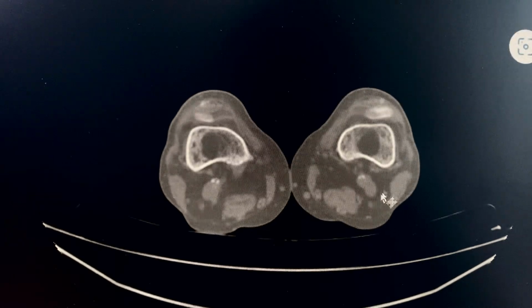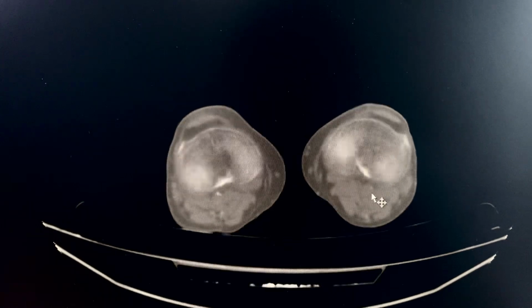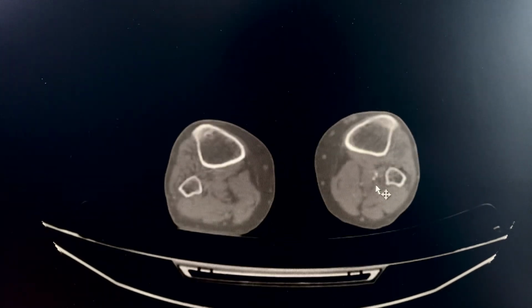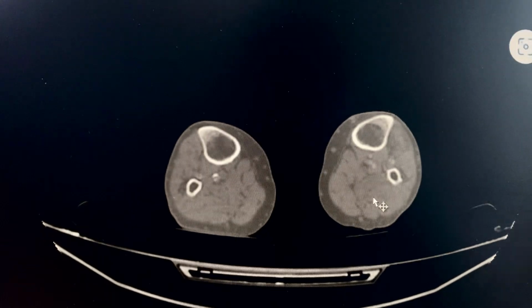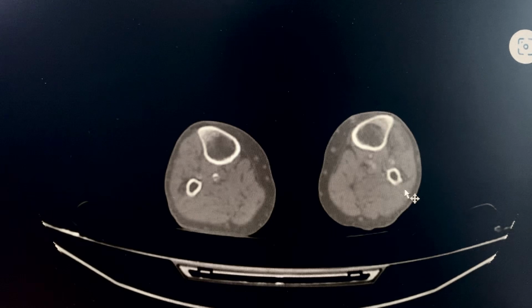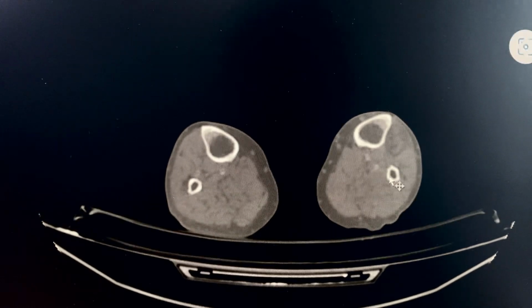You can see the popliteal vein here in the posterior lateral position from the popliteal artery, and all the way into the popliteal artery you can see the acute occlusion, the thrombotic changes, the thrombus. So you have this entire thrombus running all the way from the mouth of the superficial femoral artery, going into the popliteal artery, and then look at that.